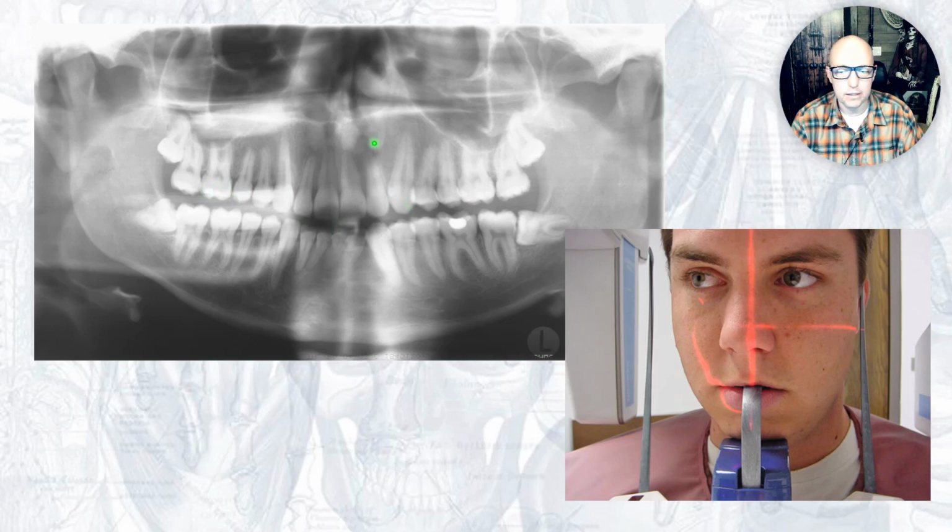You can look at the midline, and it is off a little bit to the right. So about like he's lined up here. Not super exaggerated, but just a little bit of head rotation. I still see both condyles. So maybe this isn't even bad enough where I would retake it. You want to limit patient dose if you can. If it's still diagnostic, you're okay.